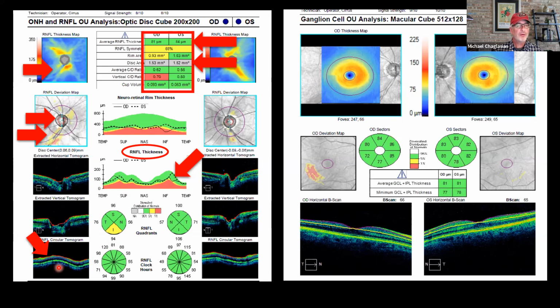And you have to be smarter than the OCT device. Your own brain power is still required here. And so looking to confirm that the OCT did its job and identified the anatomical layers of the retina, in this scan, the retinal nerve fiber layer, is part of your job, if you will, in this analysis.